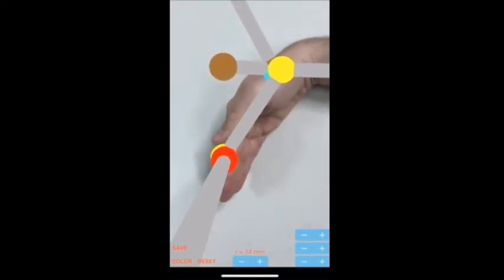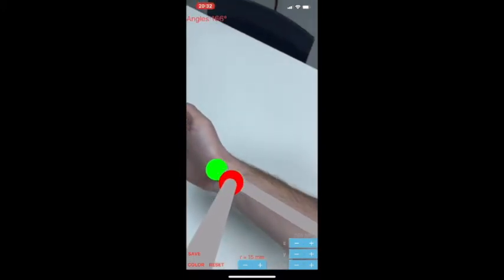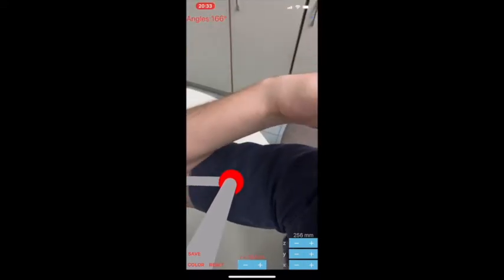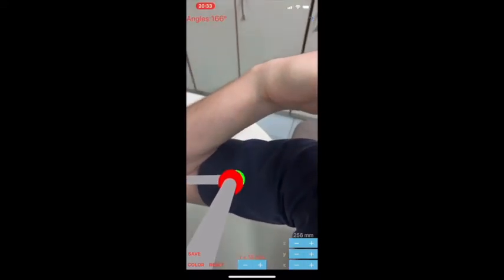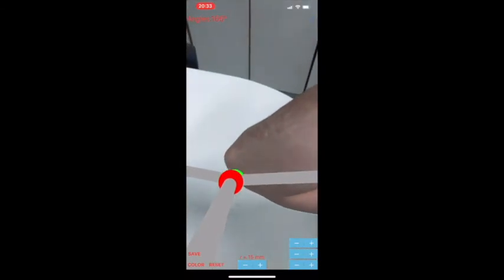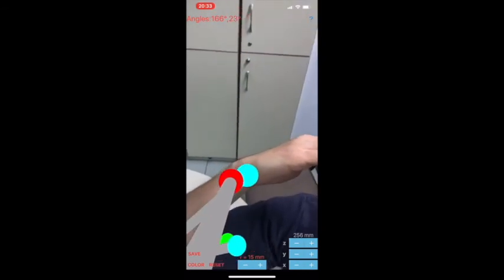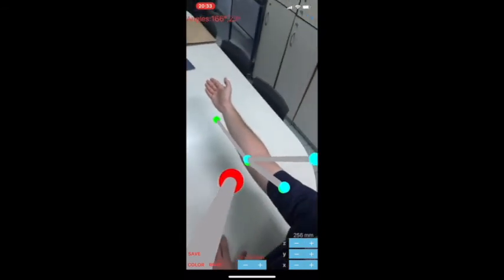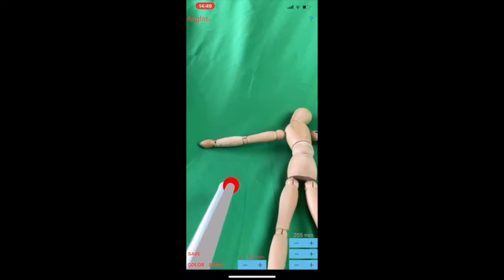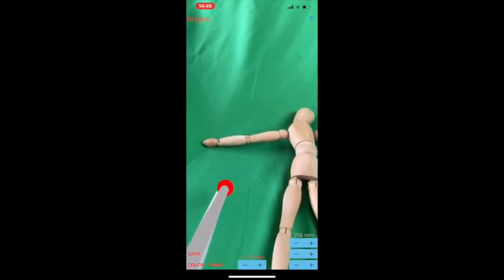The pointer tip sphere in augmented reality, AR, by the app should coincide with the mechanical pointer tip location of the rod in order to measure accurately. For achieving maximum accuracy possible, which is influenced by the user's dimensions and iPhone device, the following calibration maneuver should be done. By simply pressing the direction buttons over the screen, the XYZ position of the pointer tip sphere in augmented reality is adjusted accordingly, aiming for the pointer tip sphere in AR to be aligned in all dimensions and coincide with the mechanical pointer tip location of the rod of the iPhone case.